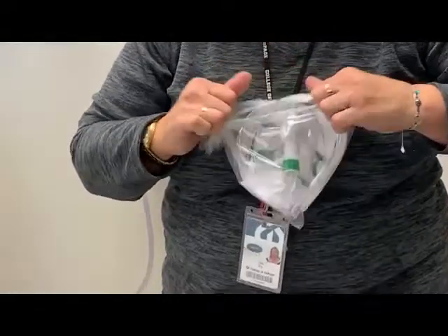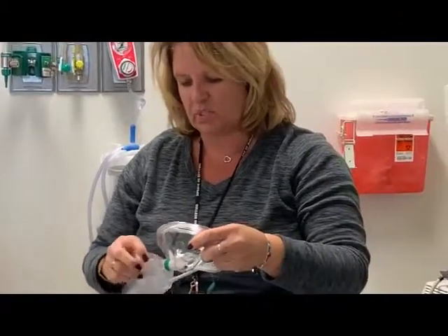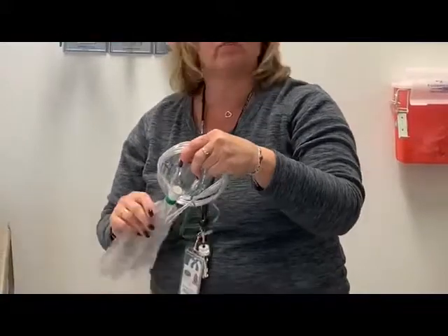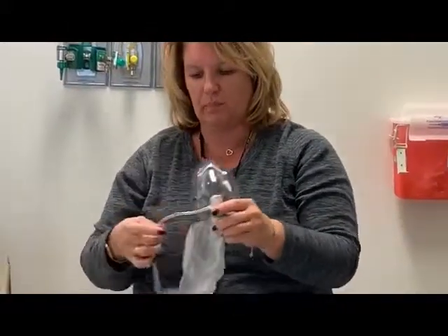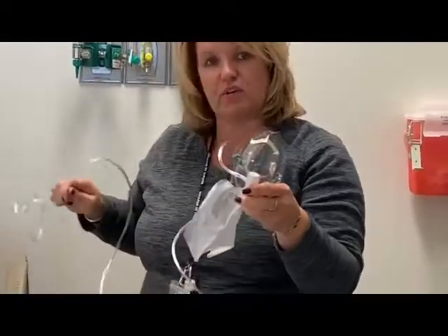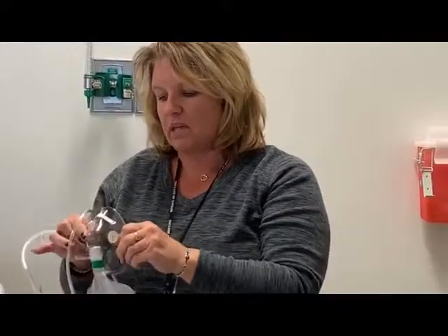The non-rebreather is a device that will deliver 60 to 80% to our patients. It's a very simple setup. It's also our go-to for a patient that has a suspected MI or a patient that comes in as a trauma patient. The mask, of course, looks a little bit different. It is a low flow device again, so it does depend on the respiratory rate and how deep they're breathing and the liter flow that we set the device on. Your minimum on this device is going to be 10 liters per minute, up to as high as flush.